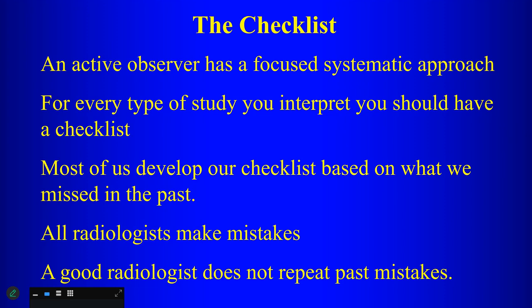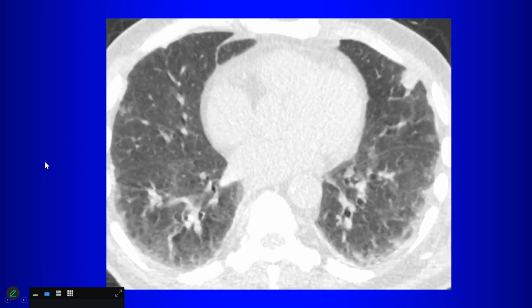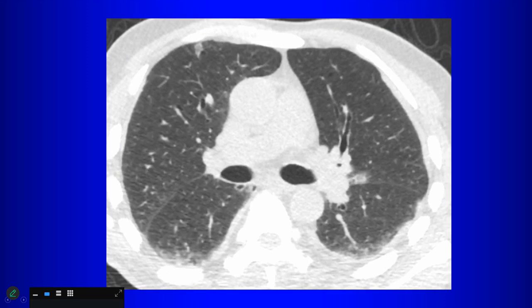So to be a good radiologist, you want to learn from your mistakes, develop your checklist, and the more thorough your checklist is, of course, you're going to be slower, but by practicing it, you're going to get faster and faster at looking at all those things on your checklist. If you're diligent about practicing your checklist on every type of study that you look at and be systematic in your approach, okay? So here's a lung cancer screening study, right?